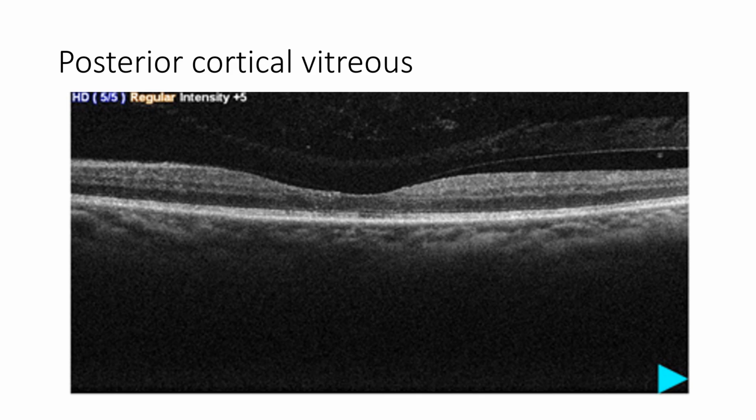Now this is one interesting photograph where the PVD has occurred, and we can make out that there is a posterior cortical vitreous which is present in this area, and this is the anterior limit of the cortical vitreous. And this can actually give rise to various pathologies like ERM, macular pucker, and macular hole, and at times it is necessary to remove these membranes so as to cause relief of the tangential traction which they can cause.